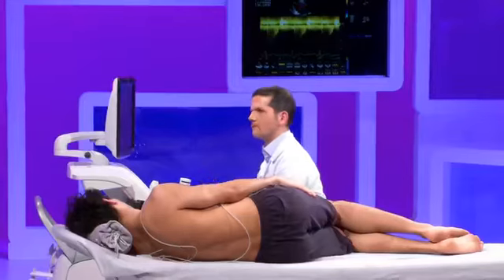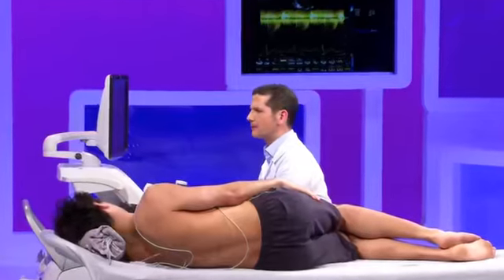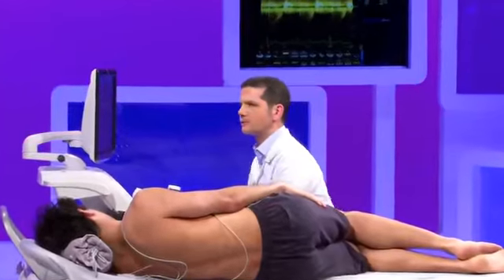And we have mitral inflow, we have pulmonary vein flow. We can combine those by looking at the differences in duration of the A wave. We then have tissue Doppler, which is very important, and the importance of measuring Vp by color M mode became progressively lower because most of the information we get from it can actually be gathered from the others.